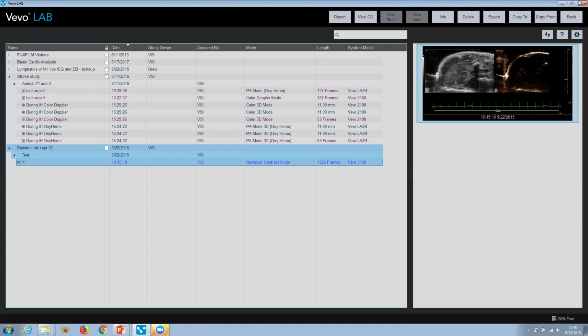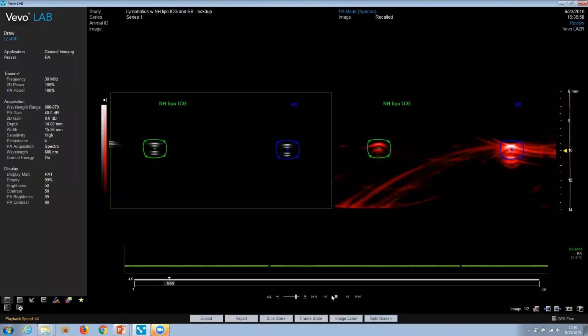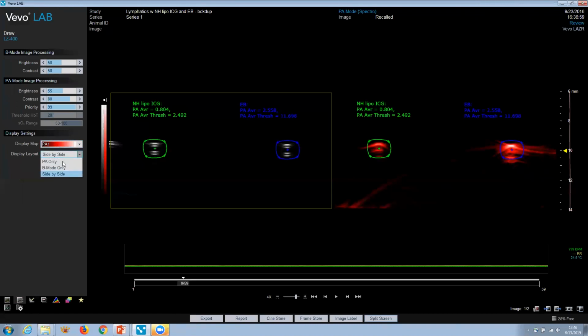Okay, I just want to point out one more new feature that I talked about a little bit before. This is about the importing and exporting of spectral curves. I won't go into great detail here, but a workflow for doing some of these molecular imaging studies is to first characterize your photoacoustic contrast agent. I've taken an example here using the Vevo LAZR to image. These are cross sections of these tubes that we use, and we have contrast agents in those tubes. You can see here that this is just a B-mode. Let me overlay them.